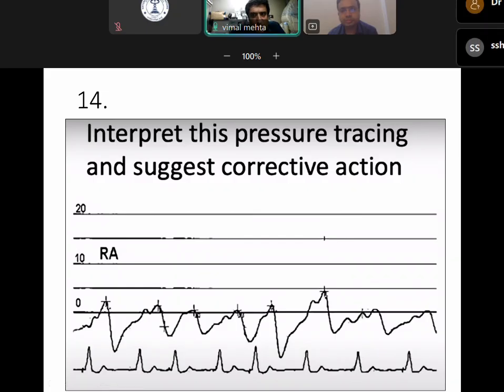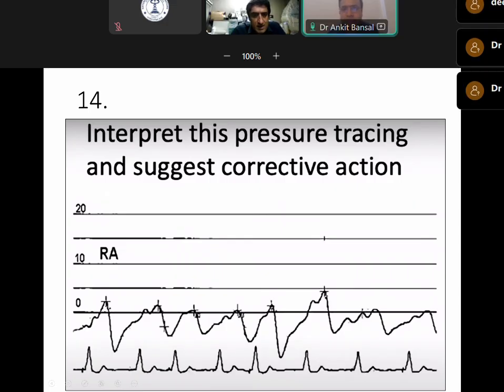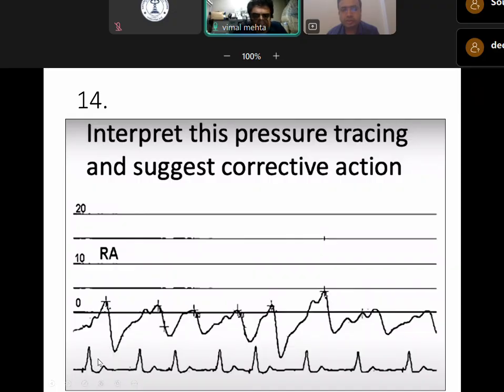Dr. Ankit, after this, we'll stop. Yes, sir, if you are okay with it. Yes, sir. But very beautiful trace.